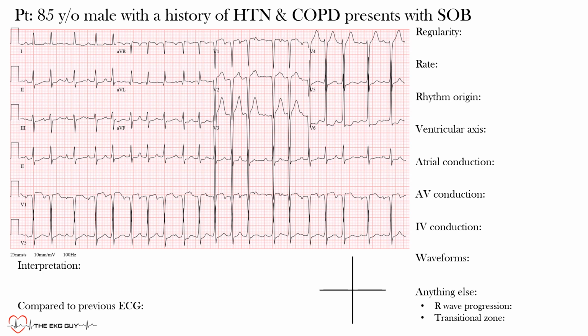After that, we'll use all the information that we've gathered to make a final interpretation of the EKG in front of us. And as always, we will compare it to a previous ECG to make sure that the one we're looking at here doesn't have any new changes from a previous one. Now I want you to pause the video and take a few minutes to go through it yourself. When you're ready, start the video and we'll go over it together.